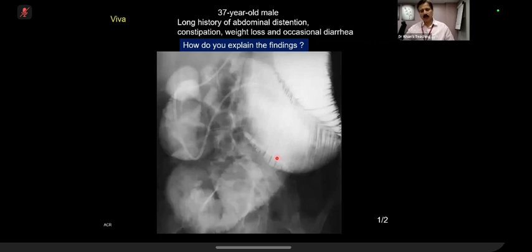Okay, very good. Now, let me tell you, scleroderma is a very, very important exam case. In MSK, you remember we did a lot of scleroderma for calcification and things like that. Similarly, GI involvement films come. Please remember that GI-wise, the most commonly involved organ is the esophagus, but film-wise, they will not show you that. They will show you a barium enema, where you will see sacculations in the transverse colon, etc. But in the small bowel, two types of findings can be seen.